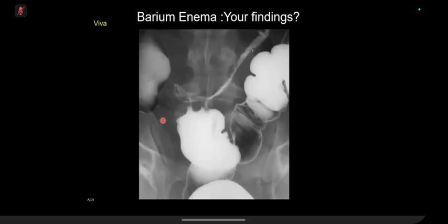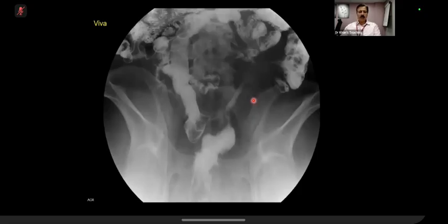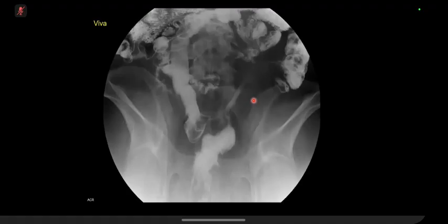So the multiple fistulas extending from the distal sigmoid colon to the terminal ileum. The basic pathology is here in the ileum, and there is a chronic type of fistula, and then there are two connections, so ileocolic fistula. The basic pathology is in the ileum. Okay. Again, similar to previous, just tell me the fistulae. Between sigmoid and terminal ileum, so ileocolic.